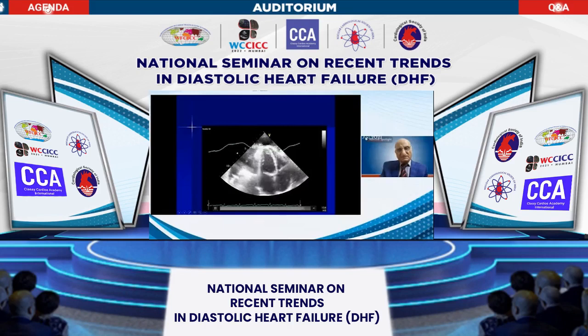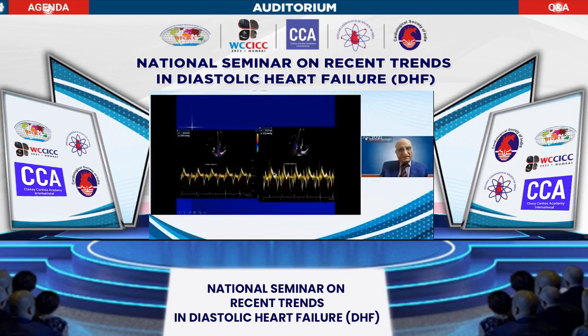So what this annulus records is the velocity of the annulus, medial and lateral, and because they are exaggerated, most of the filling occurs in the early diastole. So what happens? This is the medial annulus. You see the early diastolic velocity is about 13, and the lateral diastolic velocity is always high, which is about 17. So this is the early diastolic velocity. Remember, in a normal individual, it is increased more in these cases, and you see the lateral is more than this medial.